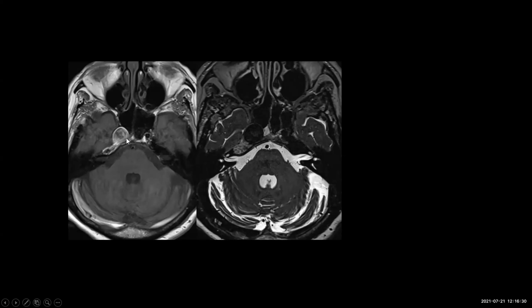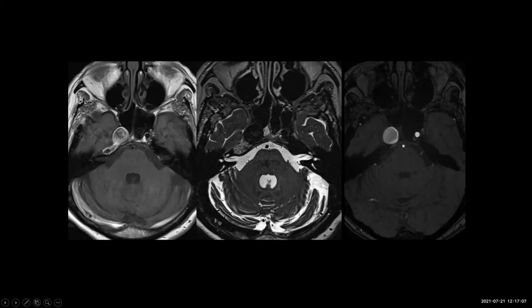We haven't really looked at the pituitary gland yet, but we'll consider whether it's a macroadenoma that's growing out. It has some weird signal on the T2 weighted image. Again, here our CSF is white, so we know we're looking at a T2 weighted image. It's super black. It is really, really black. And that should sort of give us pause. The radiologist who looked at this was concerned enough, because one of the things that gives you blackness on a T2 weighted image is very fast blood flow. So the radiologist suggested that they do an MRA, a magnetic resonance angiogram.